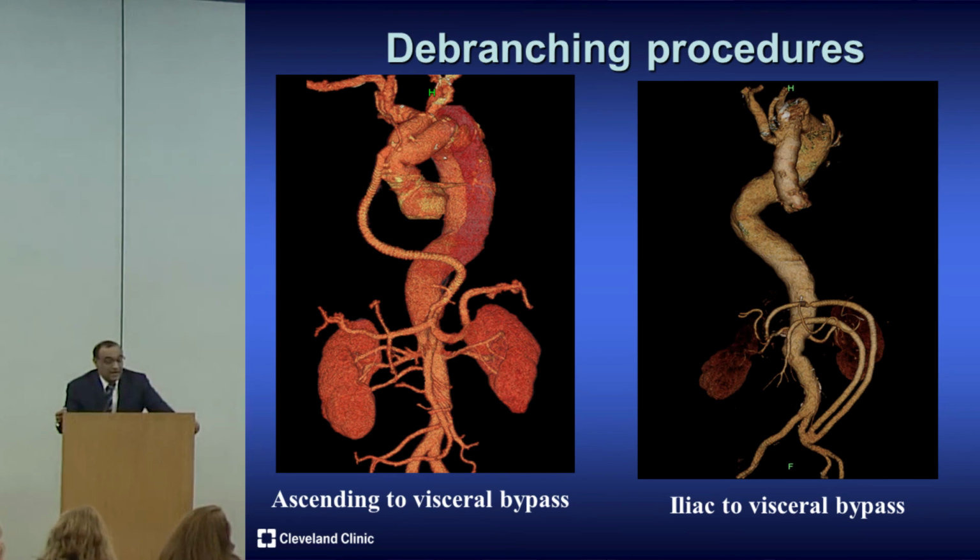And then these are some crazy images that I borrowed from Eric. You know, when I'm reading CAT scans on a Friday afternoon, and Eric has his outpatient clinic on Friday, and it's 3 o'clock and you see an image like that, you just want to shoot yourself, but you say, be glad he's on our team because of the exquisite imaging.